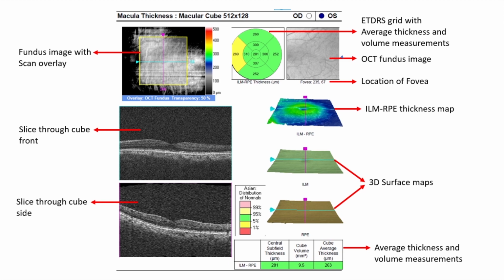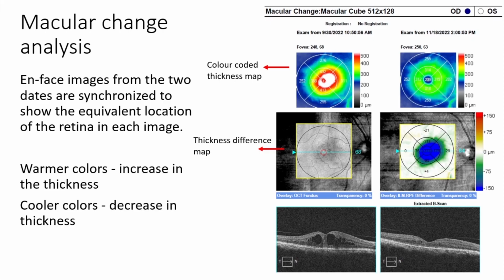Okay. But how much, will we go to the next slide? Between these two, she has chosen this slide. How much will be the difference between the two? Let's say it's not really correctly overlaid. Very little, hardly any difference at least. This is still okay. I don't think there's any. Mona, is there anything? How much?